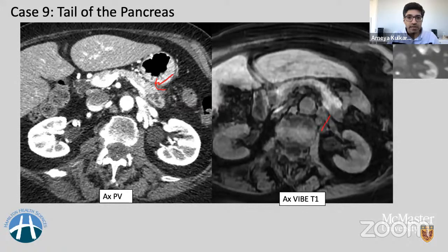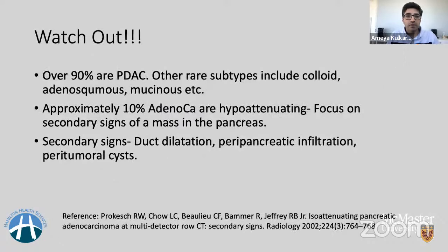Again, on MR, look at your T1 image, see how bright the pancreas looks. This is the site of the tumor, and this shows a focus of diffusion restriction. This patient underwent distal pancreatectomy and splenectomy and had the final diagnosis of adenocarcinoma of the pancreas. It was moderately differentiated. So now, before we close today's discussion, some things worth remembering.